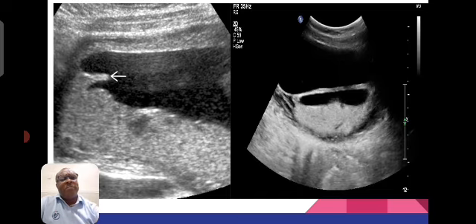Okay, now on ultrasound, this is what a circumvallate placenta would look like. A circumvallate placenta is where the amnion and chorion fold on each other at the edges of the placenta. So they now start to approach the middle of the placenta, creating this membrane. They may appear either way as you see them on this slide. The risk of this is that there is a higher risk of abruptio placenta, there is a higher risk of bleeding in these patients. So it's important that we identify this.